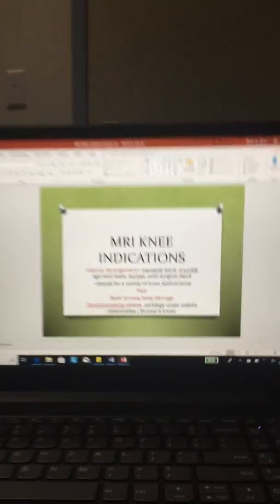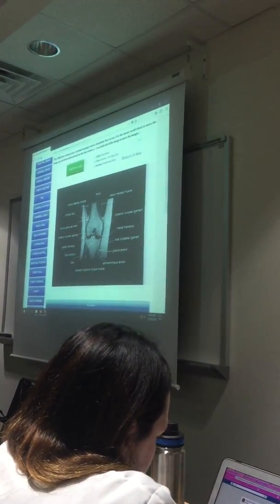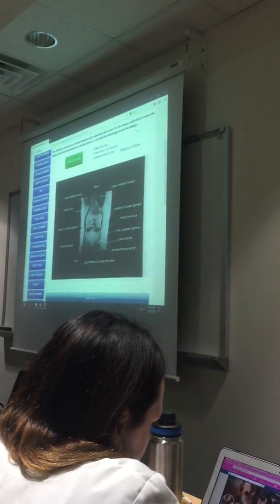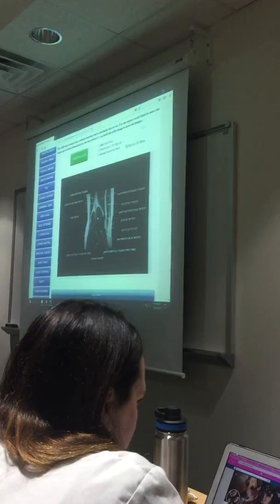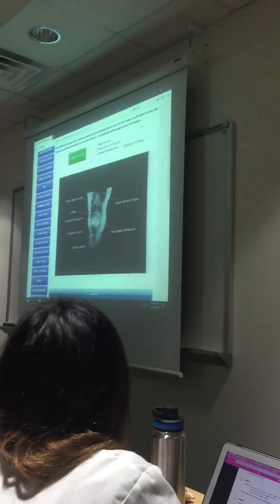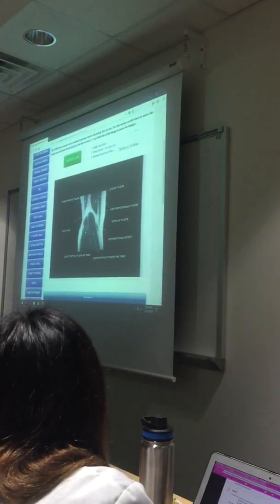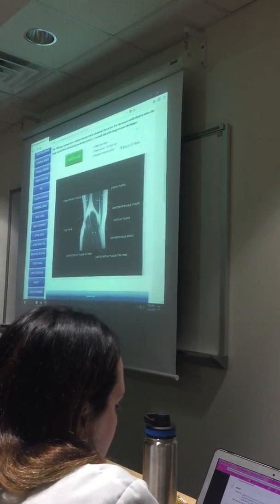My PowerPoints, looking at MRI images of the knee, and this will help with your homework. When you're looking at this coronal plane, and as we page through here, normally we scan posterior to anterior. So in this posterior aspect of the knee is where you're seeing these muscles.